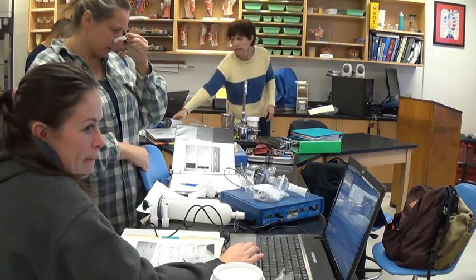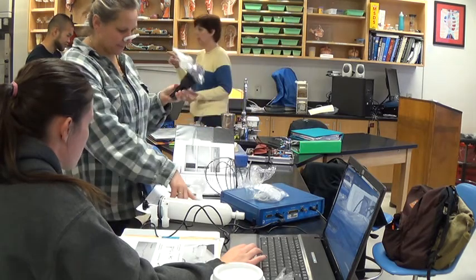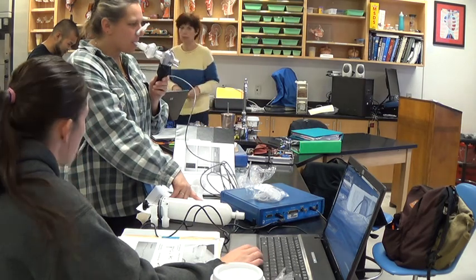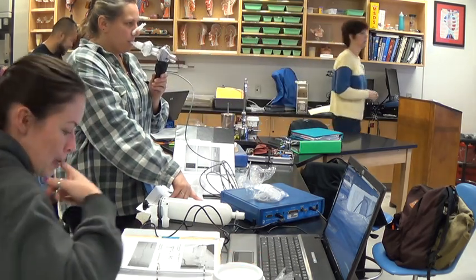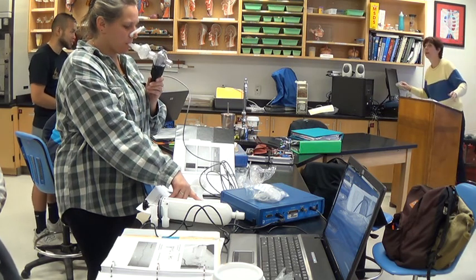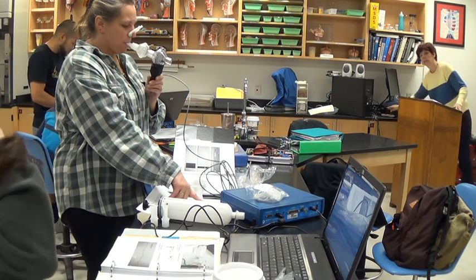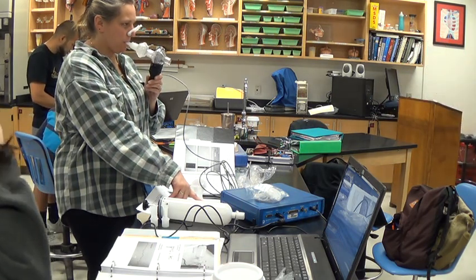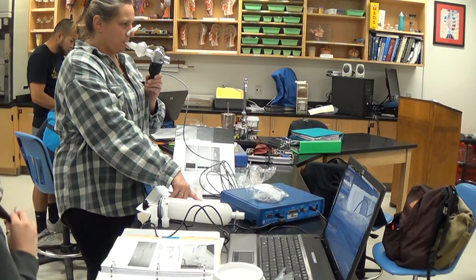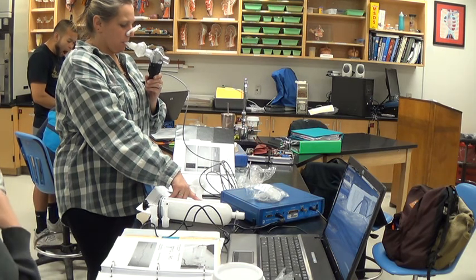We tried. Maybe I've got to go that way. Use this thing to change here. You see on here, this is on 16. Oh wait, delta T. Is there a delta T? Professor, can you help us real quick? You only get so far from this. Oh, look, I'm almost there. I'm as close to 1 as I could get.